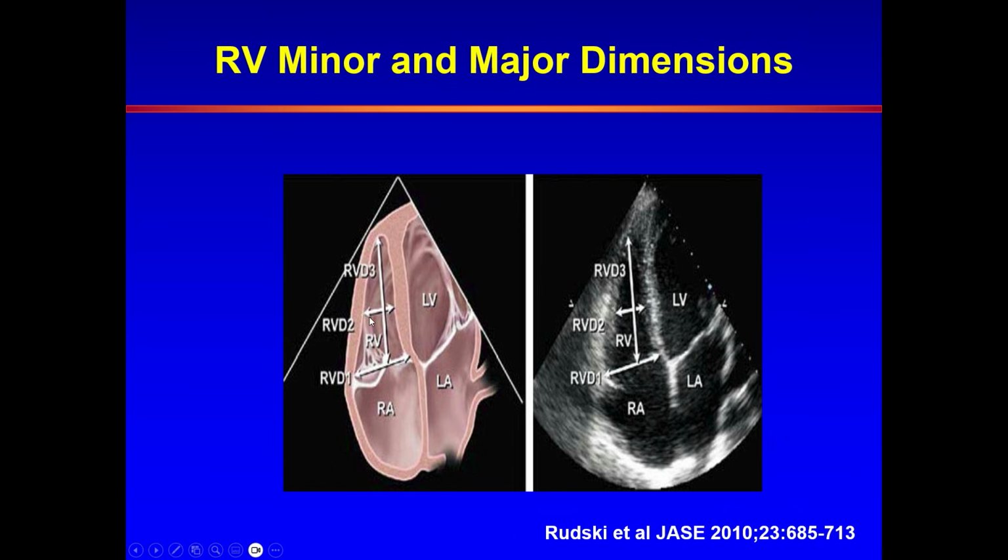The other measurement is midway in the ventricle, so it's between the basal measurement and the apex, and the upper limit here is 3.5. The long axis is taken from the base all the way to the apex. That's why it is important not to foreshorten. If you foreshorten, you will get a smaller dimension. It is less than 8.2 centimeters. The one that I would say should be measured and reported is that basal dimension.